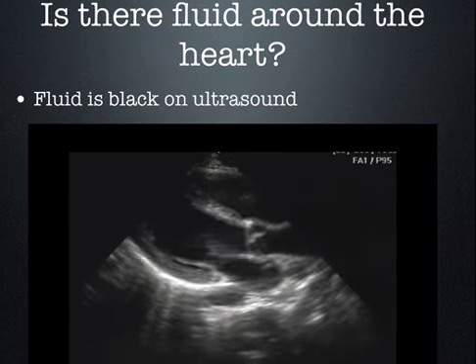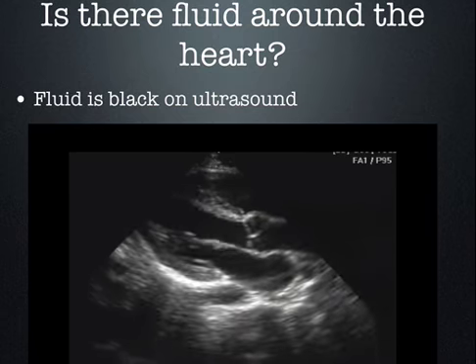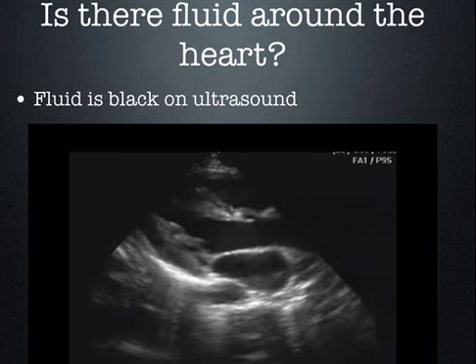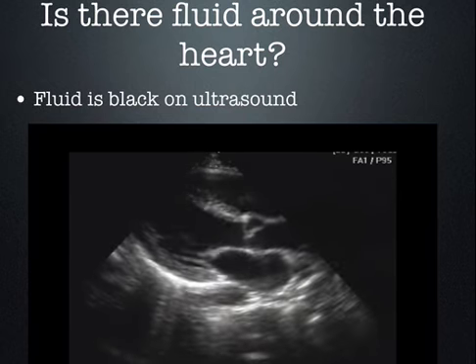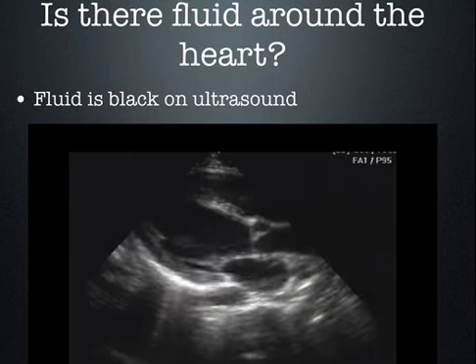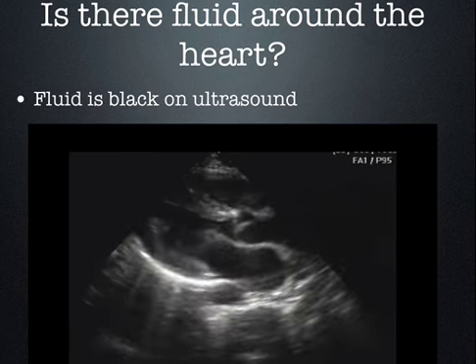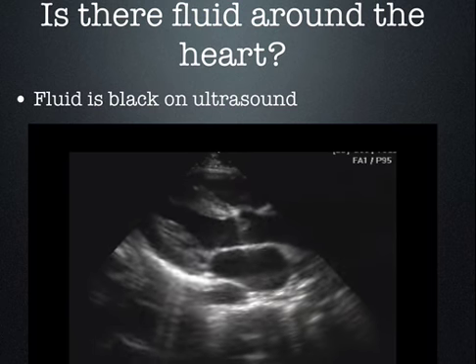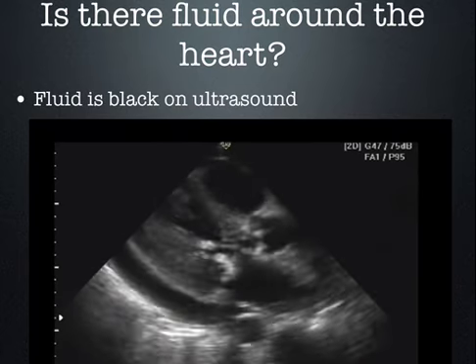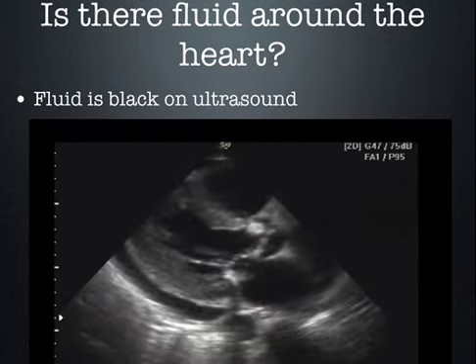Is there fluid around the heart? Well, where is the pericardium? Here's the pericardium right here, and we're looking for a black stripe there. See, black inside the LV. That's where it's supposed to be. We're looking for anything black outside the myocardium, but contained within the pericardium. So this is a negative study. How about this one? That's a positive study. This is a pericardial effusion.